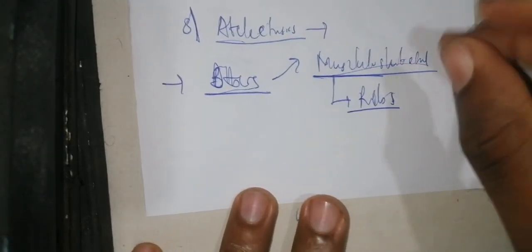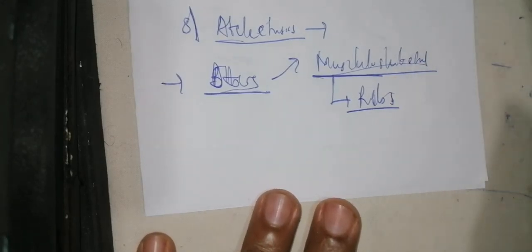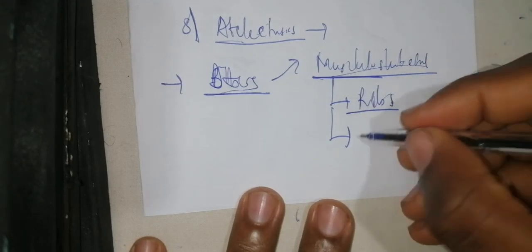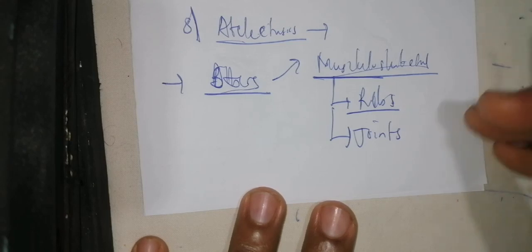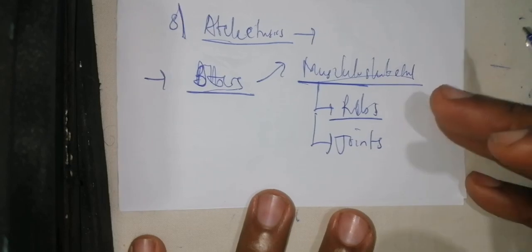So you have to look at the ribs very cautiously to find if there is any rib fracture. Is it clear? Now the next thing, you look at the joints, particularly the glenohumeral joint. You look at the scapular bone, you look at the joint to find if there is any joint dislocation. Those are very important aspects of the X-ray. After visualizing the soft tissue, you have to visualize the hard tissues. Is it clear? So those are the different elements that you have to additionally do when you are looking at the X-ray.